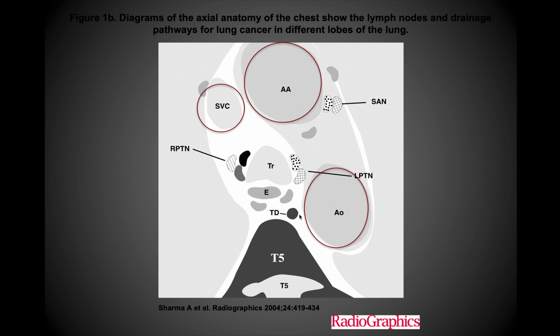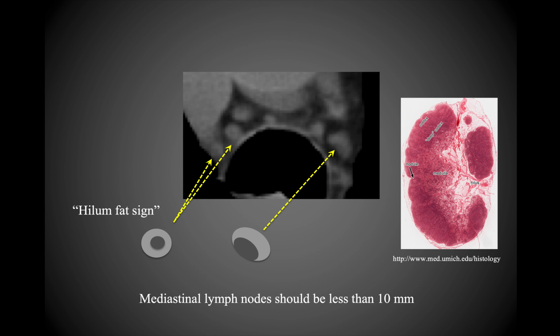Here's the esophagus, and then this back here represents the thoracic duct, which you don't see very well in the image. Really, you can't make it out in the image that we just saw a moment ago, but over here you should be able to still see the azygous vein as it's ascending. So they left that out of this diagram.